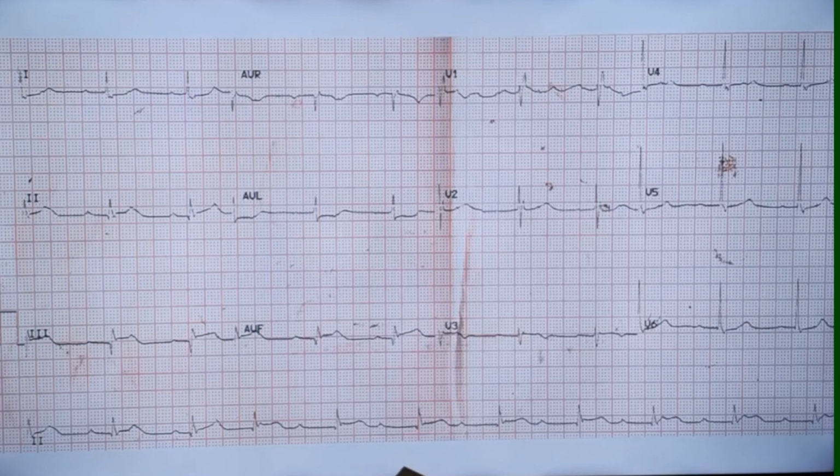So you can see that in this ECG, ventricular rhythm is regular. Atrial rhythm also apparently regular. Actually you have to measure and see. And atrial rate is higher. This is almost double the ventricular rate. Only problem here is there is an irregularity here. This RR interval is different from the other RR intervals.